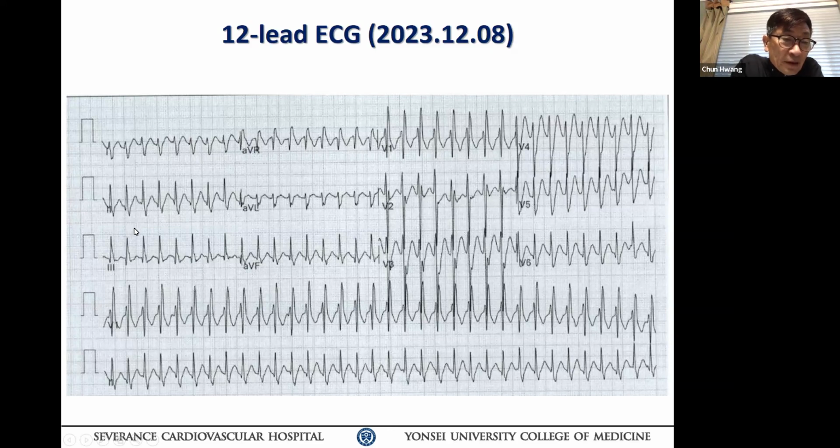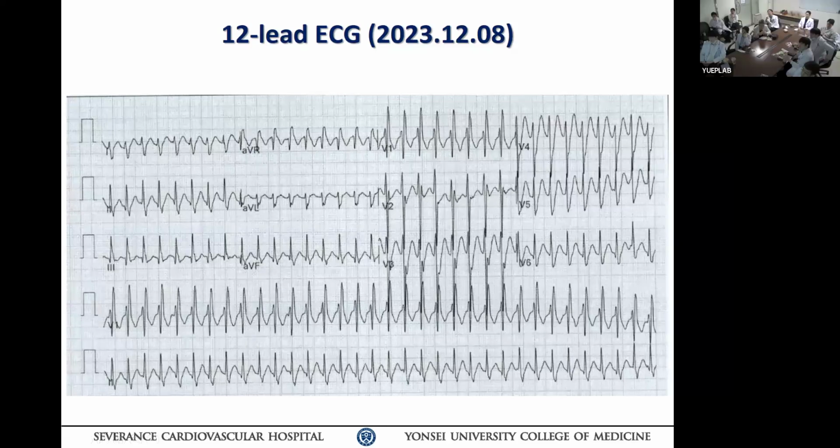In that regard, what happened? Your S wave also gets wider. That's a typical, normal right bundle branch block pattern. This is not a normal bundle branch block pattern. So we have a problem with that too. Make sense? What I'm telling you?